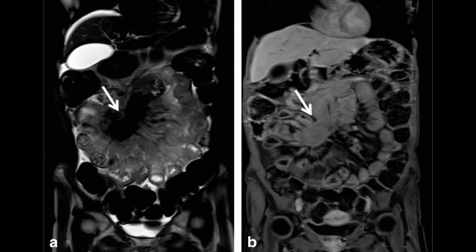Now, this is one more case of carcinoid tumor, a large carcinoid tumor, in which in the T2 it is appearing slightly low signal in fat saturated T2 images, whereas in T1 post contrast image what we are seeing is enhancement of this mesenteric mass. Also, if you see this, there is some edema in the bowel loops. Usually this happens because of the ischemia caused by these carcinoid tumors.